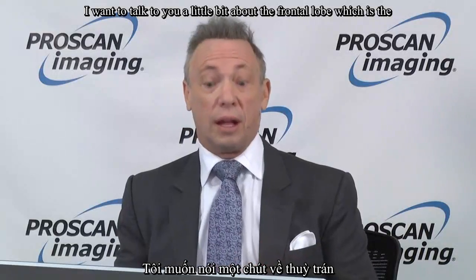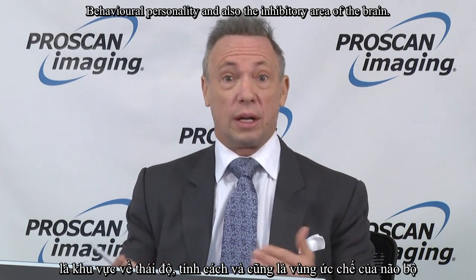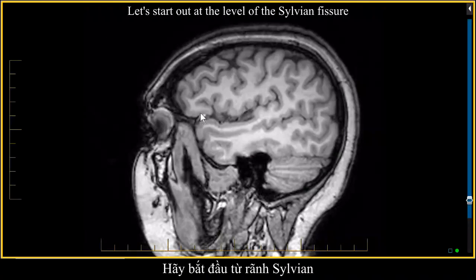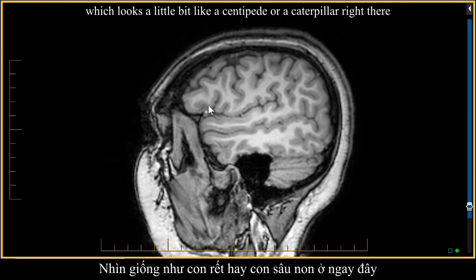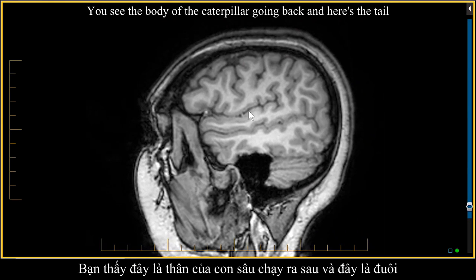I want to talk to you a little bit about the frontal lobe, which is the behavioral, personality, and also the inhibitory area of the brain. It's responsible for impulse control. And let's start out at the level of the Sylvian fissure, which looks a little bit like a centipede or a caterpillar right there. There are the antennae of the caterpillar. There you see the body of the caterpillar going back, and here's the tail.